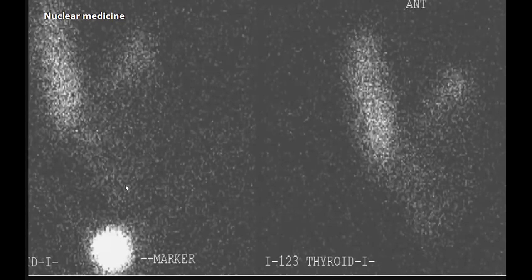Is the cold nodule a suspicious nodule or not? What do you think? And what will you do next? Yes, it's a suspicious nodule, so you have to not stop. You have to continue, as this could be a suspicious nodule. In that case, I will think that I'll do ultrasound and this patient needs biopsy, okay? So in that case, I think everyone will be happy if we mention that this case needs biopsy.